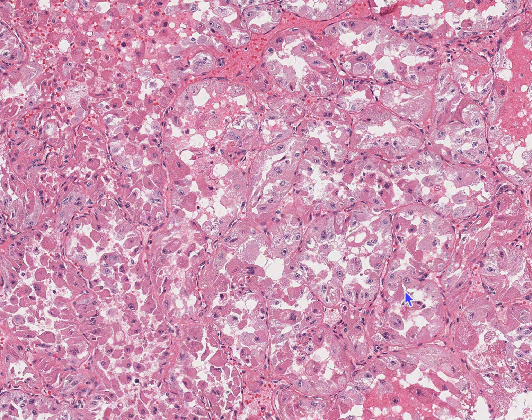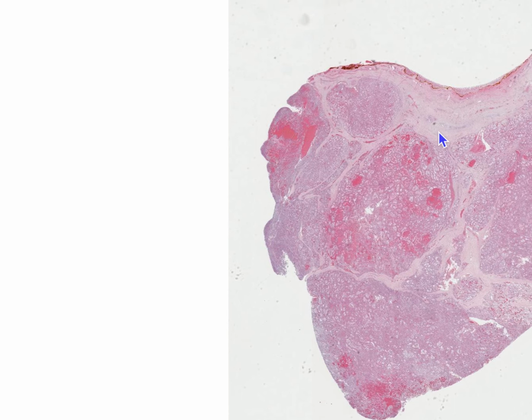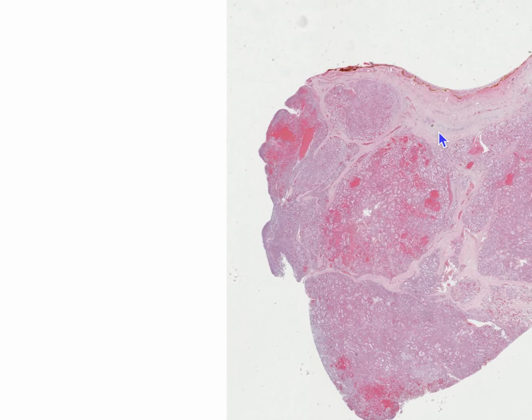So just to recap, you have your alveolar soft part sarcoma defined by an X17 ASPSCR1-TFE3 translocation. It has this classic fibrous septae, and between these fibrous septae, you have nested cells that have a pseudo-alveolar architecture.